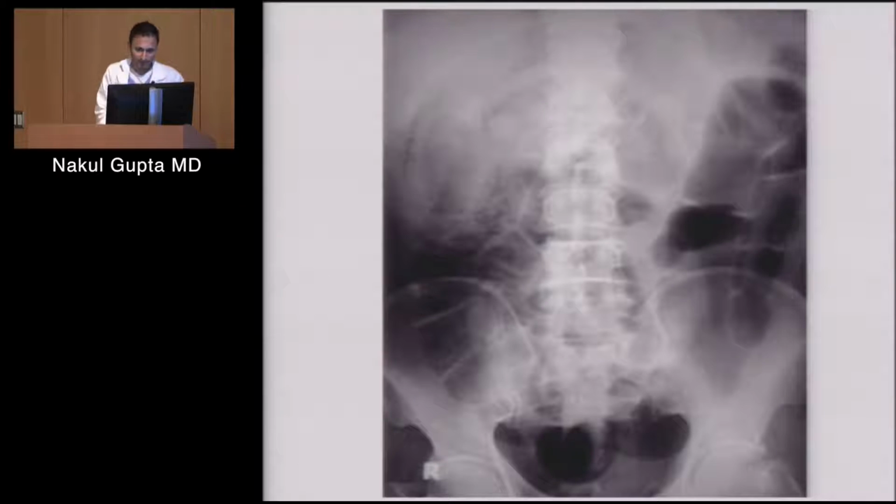All right, this is a cute case. Take a look at this for a second. What do you guys think of this?